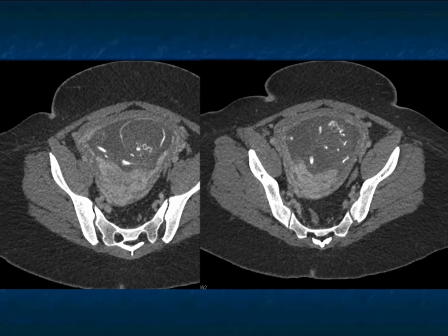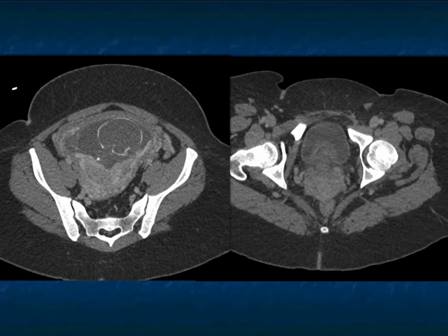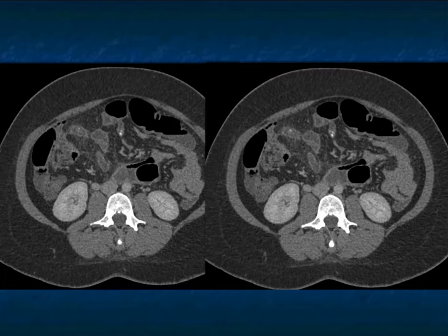Here you're looking and you're saying, I know there's some inflammation toward the right lower quadrant, but do I see anything? Can I call this appendicitis? There's a little bit of fluid by the rectum, so there's some inflammation, but it's only when looking at all the images, and in this case scrolling upward, the appendix was pushed higher because the colon was pushed up, and that's the appendix with appendolith, and that's the patient's acute appendicitis.